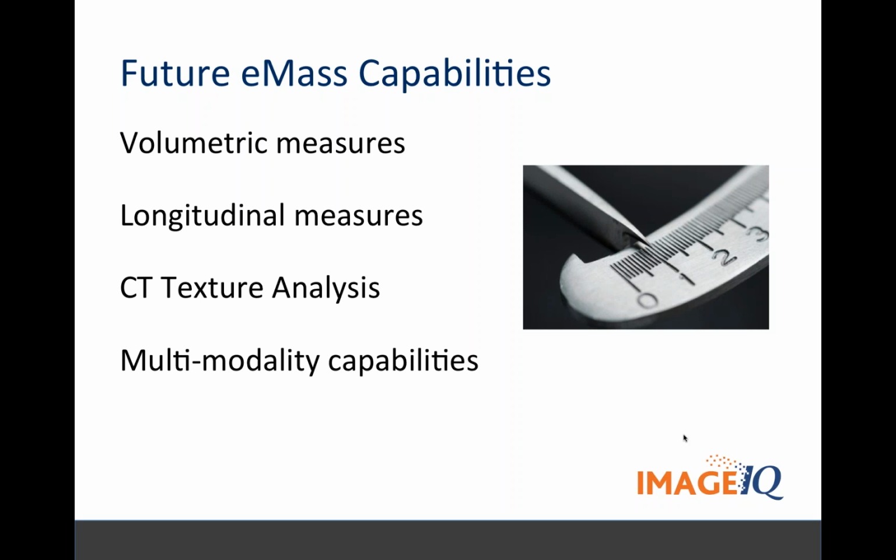And this is going along with some of the initiatives that are out there, particularly for QIBA. It's the Quantitative Imaging Biomarker Alliance, and they're trying to validate the use of volumetric tools for measuring these nodules over time. You also saw Andrew making these measurements with 2 different time points for the same patient, and he was zooming in and matching the slices.